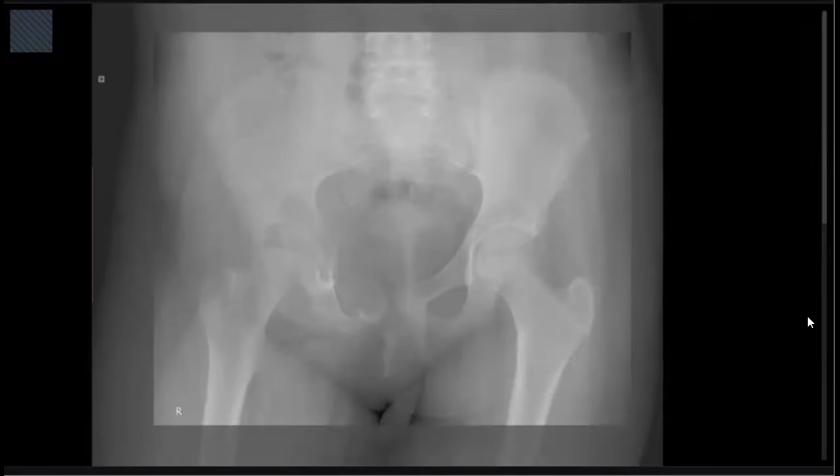So this is a bone lesion. This is a lytic lesion which is involving the superior pubic ramus and extending towards the acetabulum. Now we are starting to talk well, but before that I didn't hear anything from you. You were just trying to go through fractures, and now you should describe well. Describe what you are seeing. This lytic lesion is involving the superior pubic ramus and extending towards the acetabulum. Which superior pubic ramus? The right side. Okay, you have to mention right.